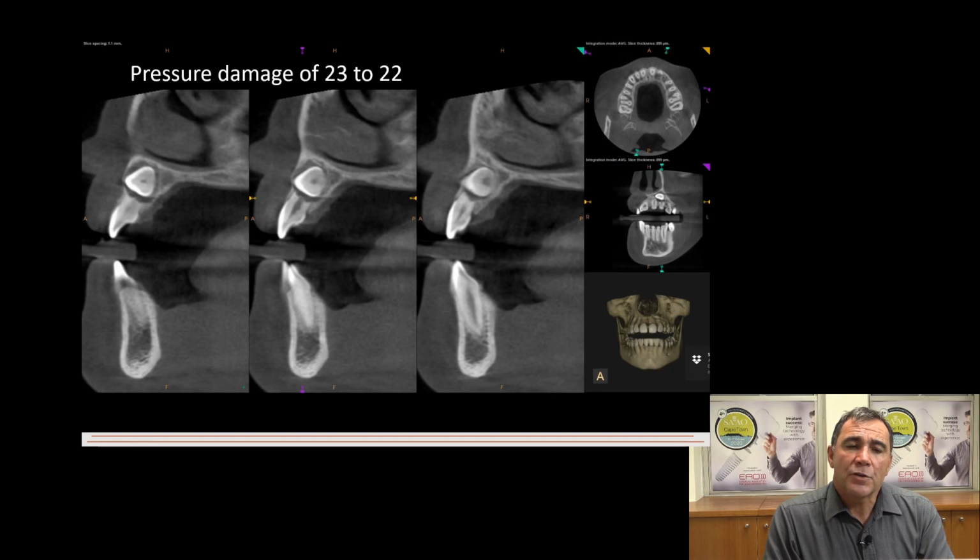In this young patient, the canine could not distinguish between primary teeth or permanent teeth, and unfortunately we had to remove this lateral tooth. We are going to keep the space open for an implant at age 18 or 19, or when it is most clinically relevant to this patient to use.